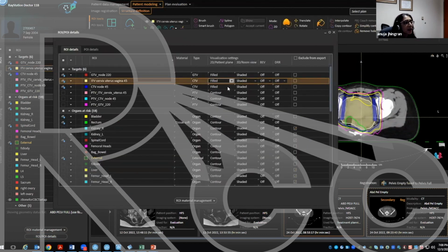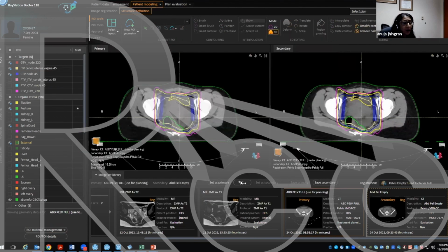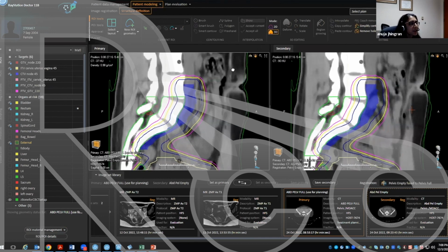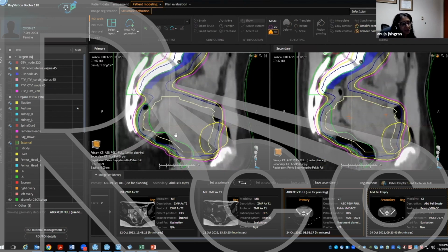And so we were worried. With the retroverted uterus, let me just show it to you so that you can see it. Her uterus is actually going backwards. See that right there, right? And you can see it really didn't hurt. This is her bladder empty, right? This is the bladder being full, but it's totally empty.